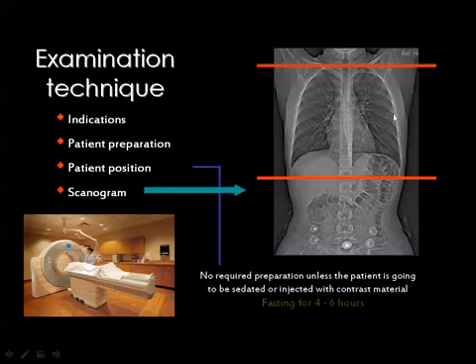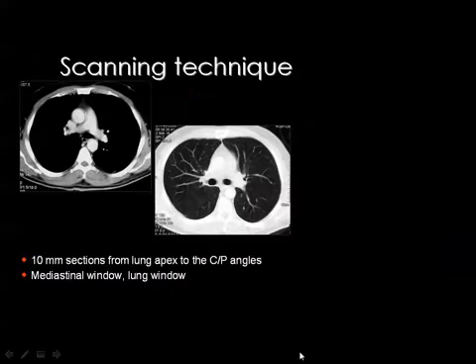If you would like to do so, and I will show you the indications, then you inject the patient with contrast and you push the button on the keyboard, which signs that you have injected the patient with contrast, in order for this word to appear on the image. If you don't like to inject the patient, or there is no indication to inject the patient with contrast, then you say no, and you go immediately for scanning.